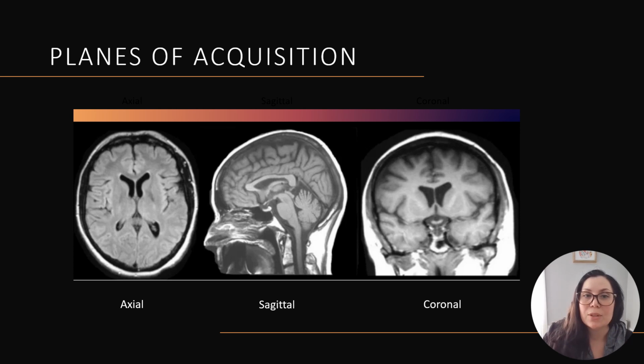It's important to distinguish the cross-sectional anatomy in different planes so you can plan your next sequence. When setting up your scan plans for MRI, if you don't see the anatomy you need, it's important to relocalize. It's only an extra 30 seconds typically.